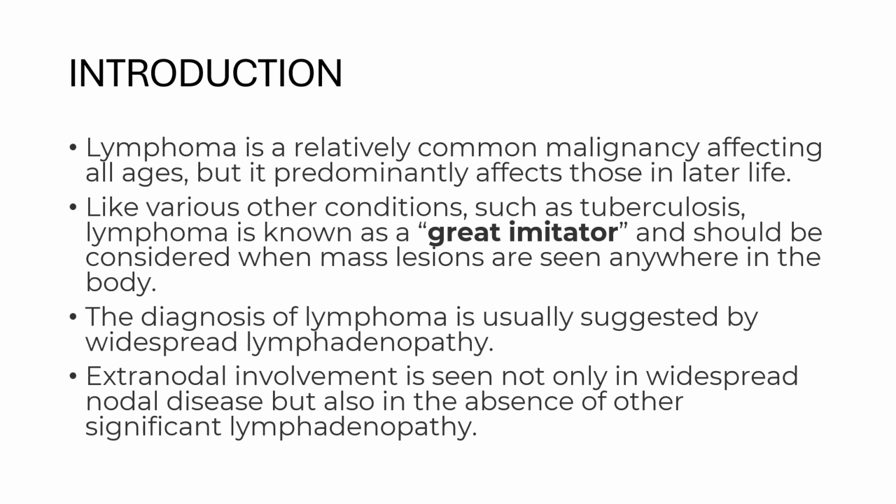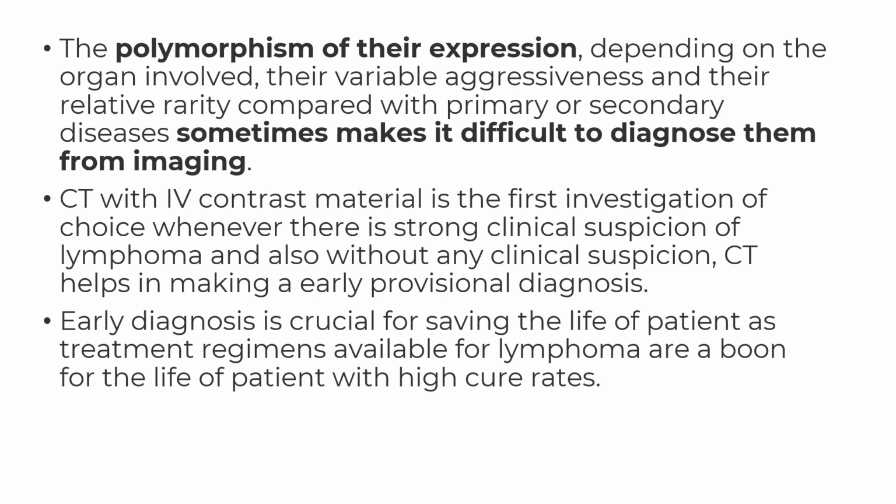The diagnosis of lymphoma is usually suggested by widespread lymphadenopathy. Extranodal involvement is seen not only in widespread nodal disease but also in the absence of other significant lymphadenopathy. The polymorphism of their expression depending on the organ involved, their variable aggressiveness, and the relative rarity compared with the primary or secondary diseases sometimes make it very difficult to diagnose them by imaging.